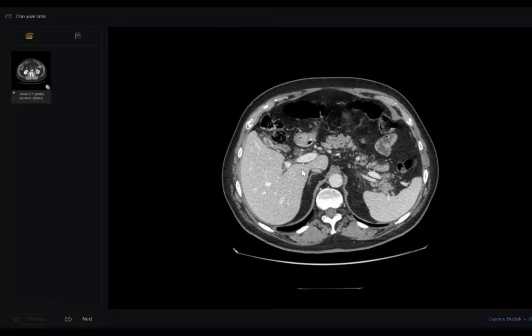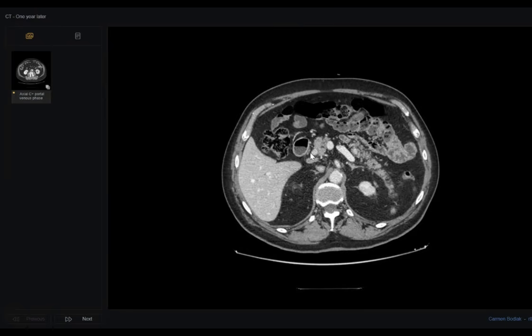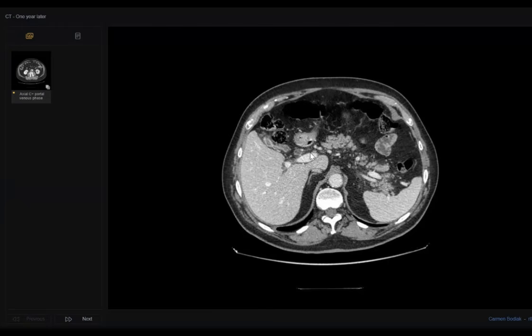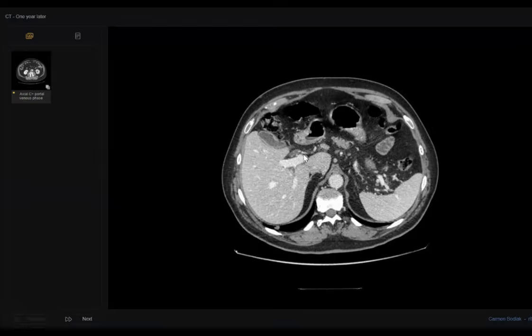Please follow the common bile duct. Yes, it is dilated. And what happened here? This abrupt cut off. It's narrowed now. I think there is some thickening in the distal common bile duct, and surrounding fat stranding and enhancement. So it is enhancing. This is going with cholangitis.